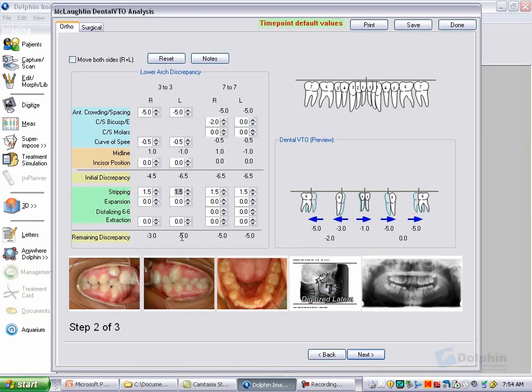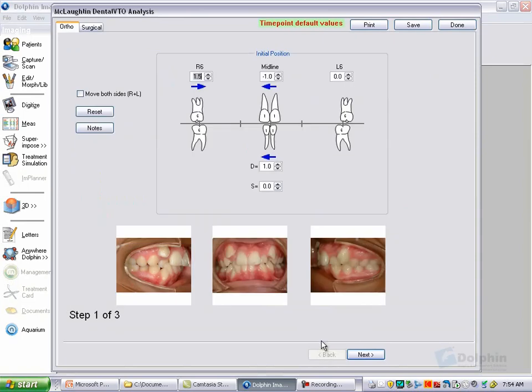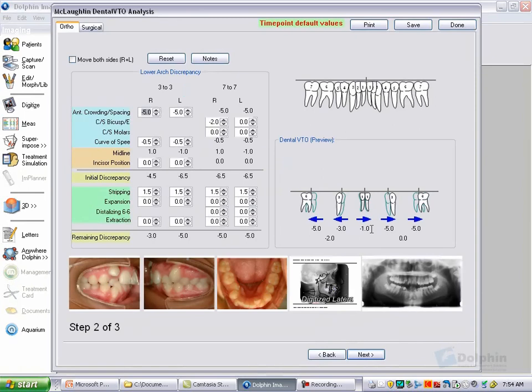And this gets us moving into our tooth movements. The lower canine is the key as to where things are moving. We can look at the midline. We recall from chart 1 that the lower midline was 1 millimeter to the right, and the correction will be 1 millimeter to the left.